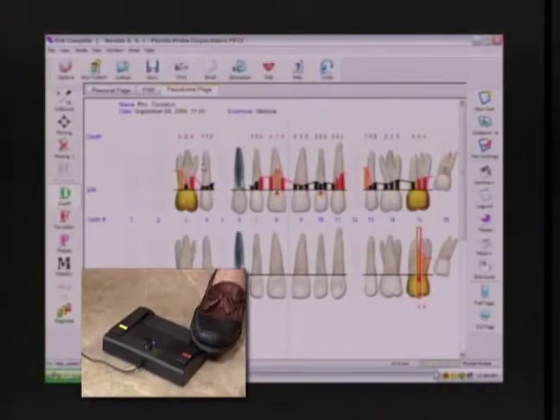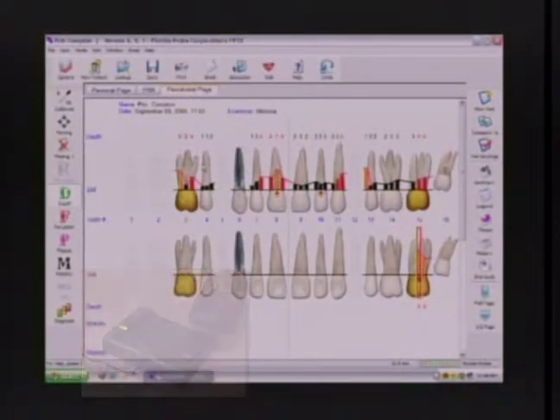Third common mistake, you simply misstep on the foot pedal and hit bleeding, and you didn't mean to. Those bleeding and suppuration pedals are on-off switches. So all you have to do is hit it again, and it goes away. Bleeding goes away. I don't even have to go to the undo button.